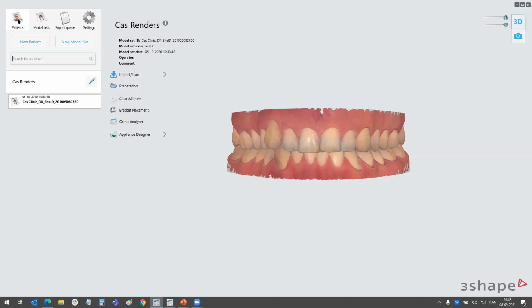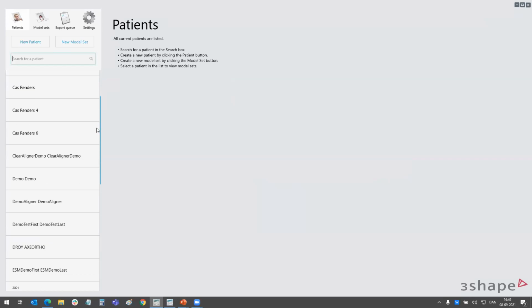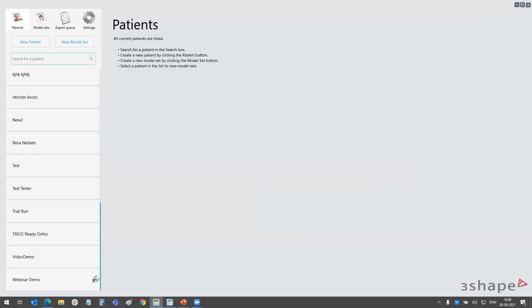Another thing that's worth noting is that you might notice this little padlock here. That's because I have this case open here. Even if you have a client server set up with a lot of clients, if one of those clients opens a case, then instantaneously all the other clients will see this padlock, and they can even be told which of the other workstations is now working on this particular case. So much more effective than the old system regarding who's working on what. So people don't accidentally try to work on cases where other people are already doing good work on them.